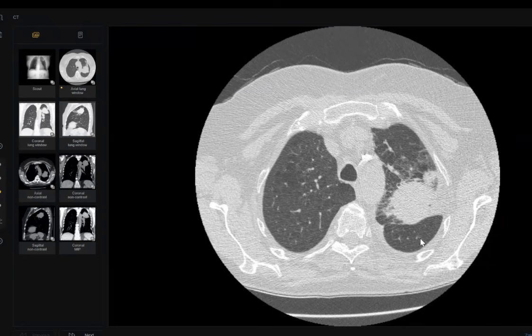See, my colleagues, if you go from here, almost you will get a complication in the form of pneumothorax, and also from here. Suppose all of this lesion is viable, like we saw in the PET CT, it is better to go from here. Why? Look here, this is the pleura. Here the lesion is completely inseparable from the pleura.